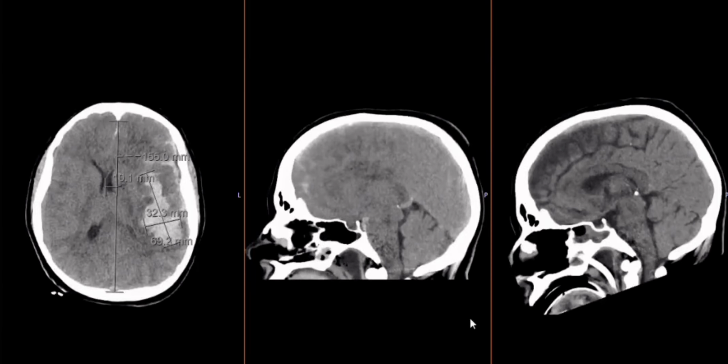About there is comparable: mid-pituitary fossa, cerebellum, fourth ventricle, pons, and no space in front of the pons. And now we have more CSF space around the pons. The cerebellum doesn't look like it's pushing out through the foramen magnum as much, and so there's less pressure squeezing this section of brain. Make sense?